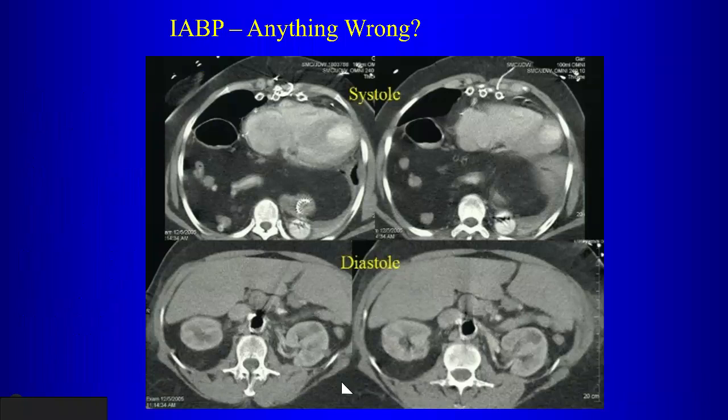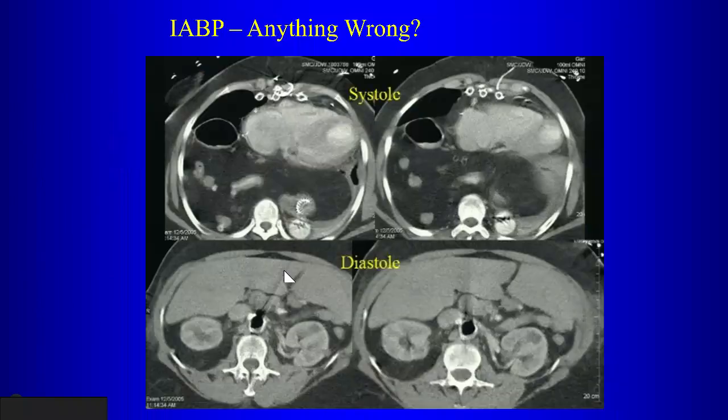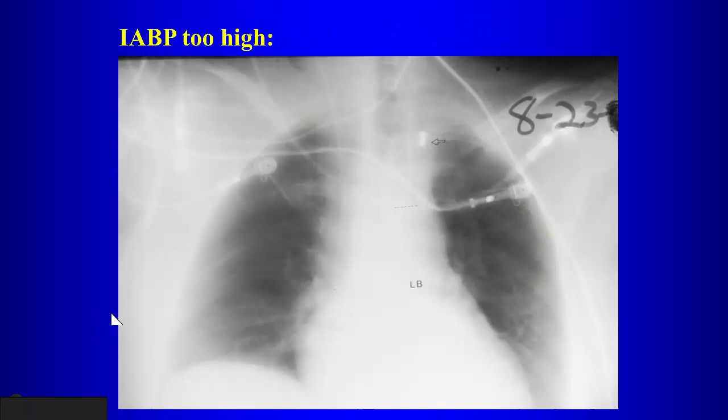Was that one too low? It's a little bit low. So this one, you can see it's expanding near the renal arteries. Not a good idea. And then this one is way too high.